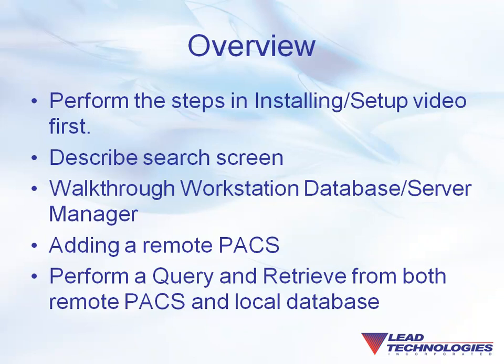In this video, I will first describe the layout of the search screen. Next, I'll give a walkthrough of the Medical Workstation's database and server manager. Then I'll illustrate how to add a remote PACS from which to perform query and retrieve operation. And finally, I'll perform a query and retrieve operation from both a remote PACS and from the local database.